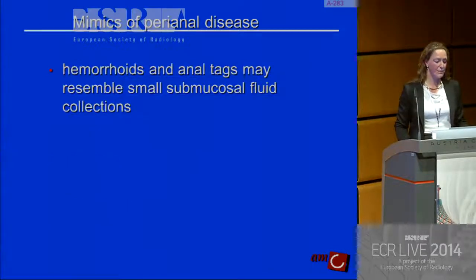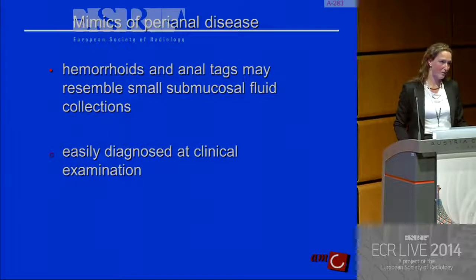And then lastly, hemorrhoids and anal tags. They could resemble small submucosal fluid collections, but the surgeon or the gastroenterologist should easily diagnose these at clinical examination, so there should be no confusion about these.